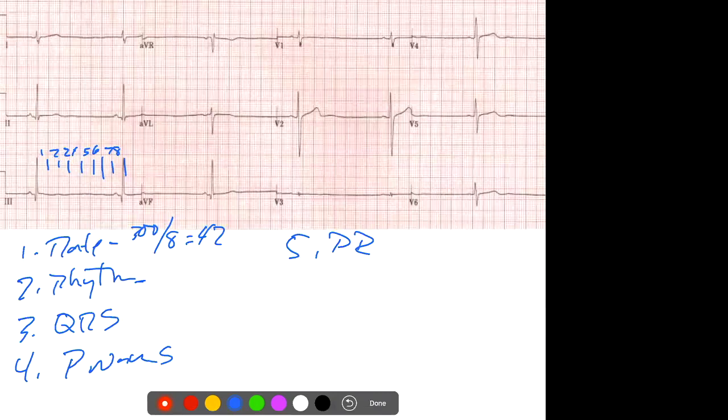Yeah, some EKGs don't have a rhythm strip at the bottom. So sometimes they may, sometimes they may not. It shouldn't mess you up. Even though the lead changes here, the rate would remain the same if you counted 30 blocks over, okay? Even though the lead changes, it shouldn't affect that.